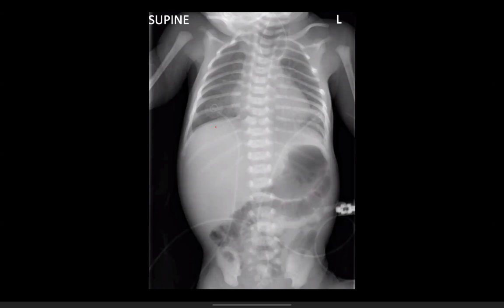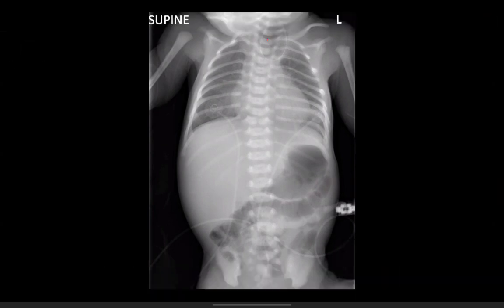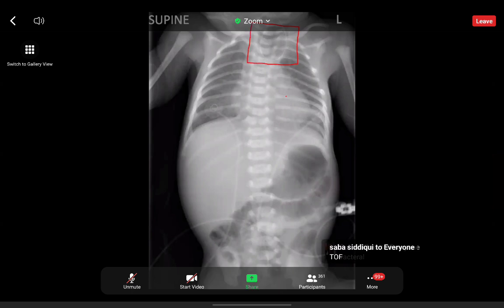This is a 1-day-old on the neonatal unit. So I can see people saying already, you've very well spotted that at the top of the image, we've got a coiled NG tube that cannot be passed down the esophagus. That's because we've got an esophageal atresia. So you can see there's lucency here in the proximal esophageal pouch, and it's dilated, which suggests we've got an atresia or a pouch here that the NG tube can't pass beyond.